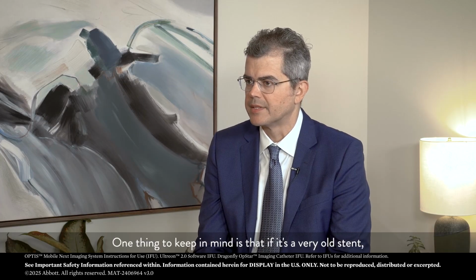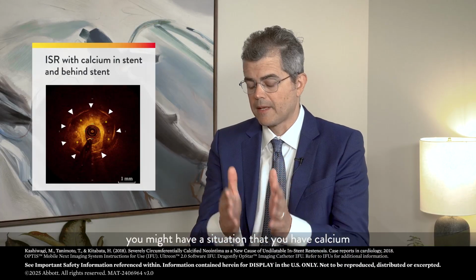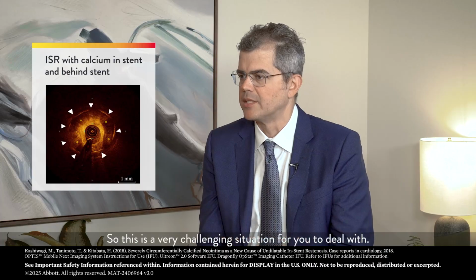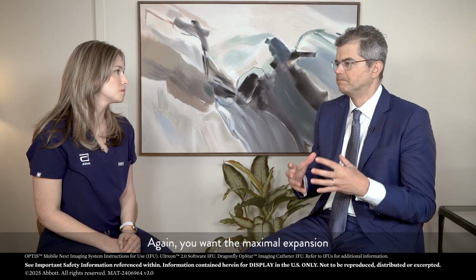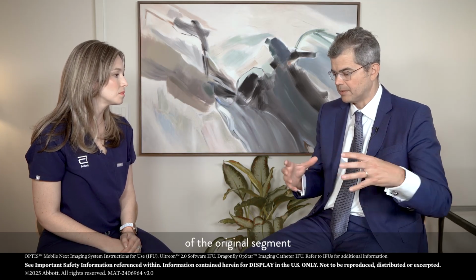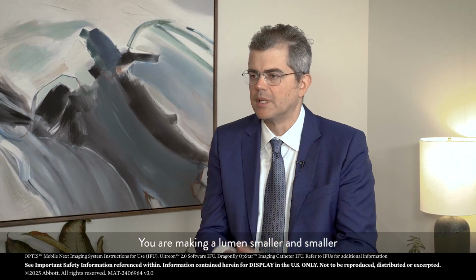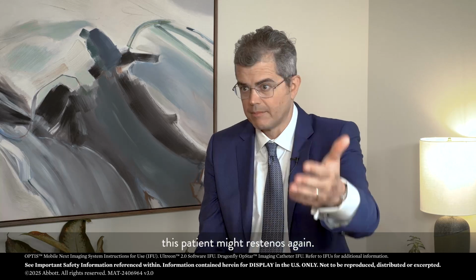One thing to keep in mind is that if it's a very old stent, you might have a situation that you have calcium in the luminal side, and you also have calcium behind the stent. So this is a very challenging situation for you to deal with. Again, you want a maximal expansion of the original segment, because you are adding material there. Right. You are making a lumen smaller and smaller, and you need to anticipate that this patient might restenose again.